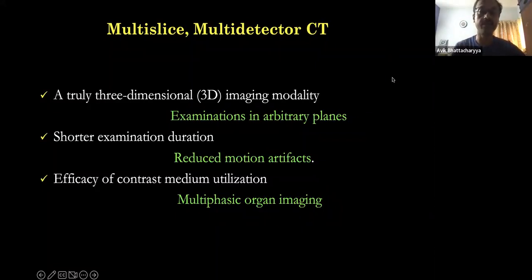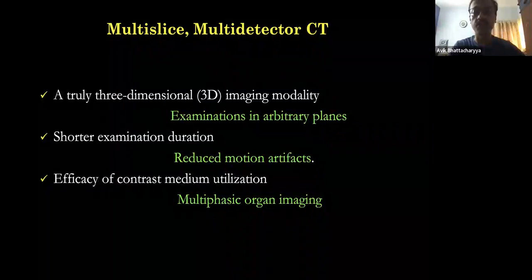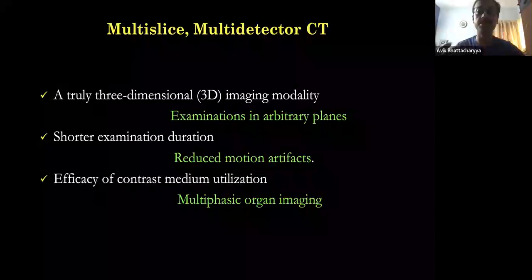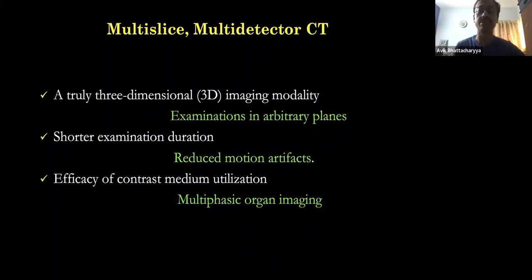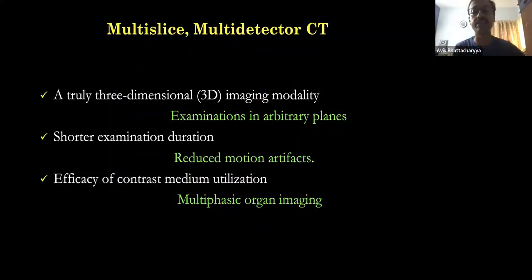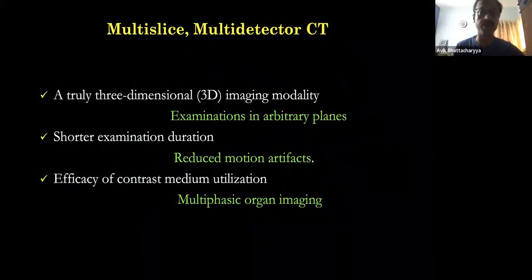Why are these important? Why do we do that? To differentiate different lesions in our body, and the common pictures when you see a CT scan, we will discuss. So it would be an interactive session. In between the discussions, I would request you to tell us something about what's going on inside that screen. You please join, then it will be more informative and more interactive.